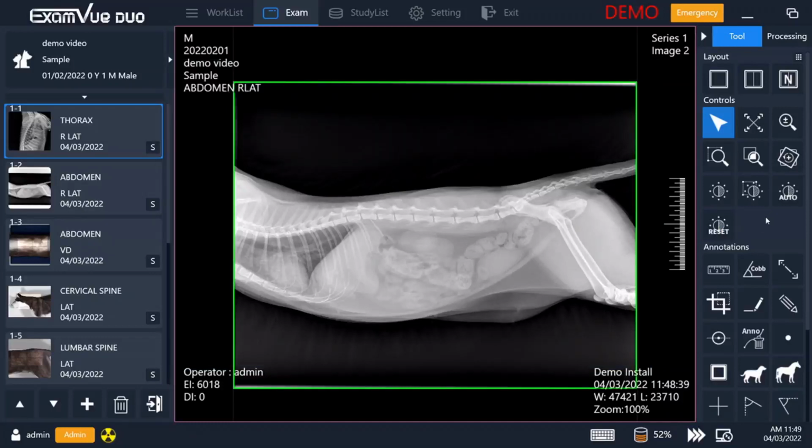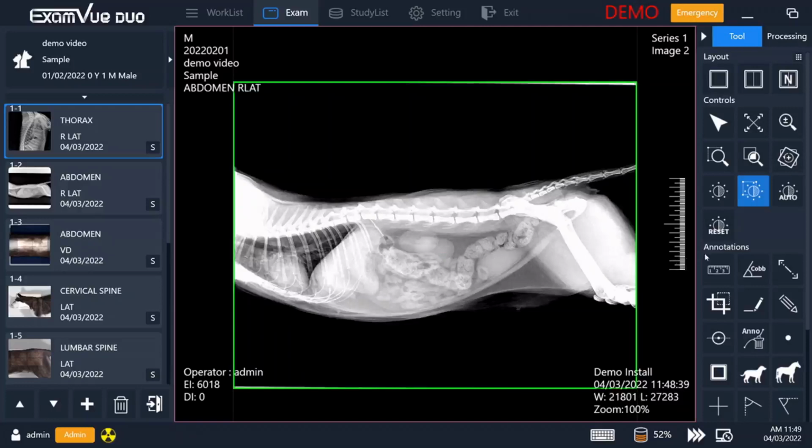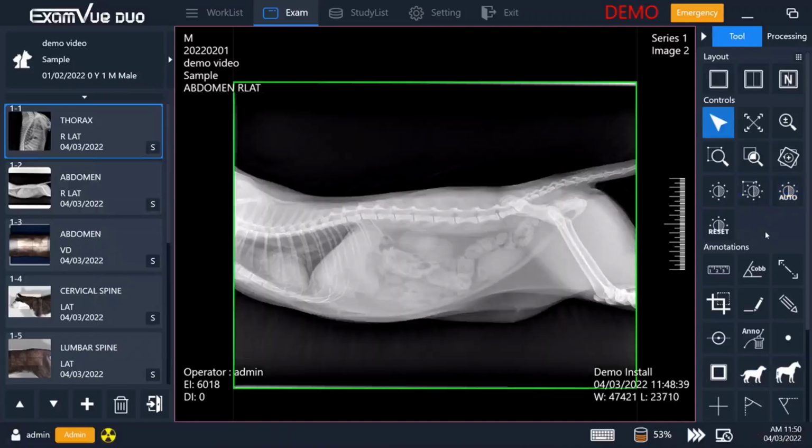Useful tools that are commonly used would be things like free rotation, if you're going to be doing stitching, which is also included in our software. The region of interest window level will let you window level to a specific area you care most about. If you wish to emphasize, say, the window level in the guts and take a good look at that area and increase the contrast to the best possible there, at the cost of the appearance of some of the rest of the image, then you can return at any time to the automatic one that the software thinks is the best.